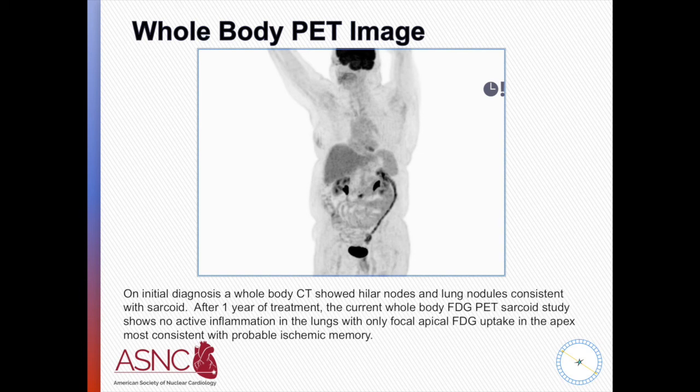So the patient also went for a whole body PET study as part of the Sarcoid protocol. I think the first thing that we need to say is that there's this great discussion between just doing cardiac PET images without the whole body images. But I think if we're able to have that information, it's useful in terms of guiding management in this patient, as we're going to see in this case.